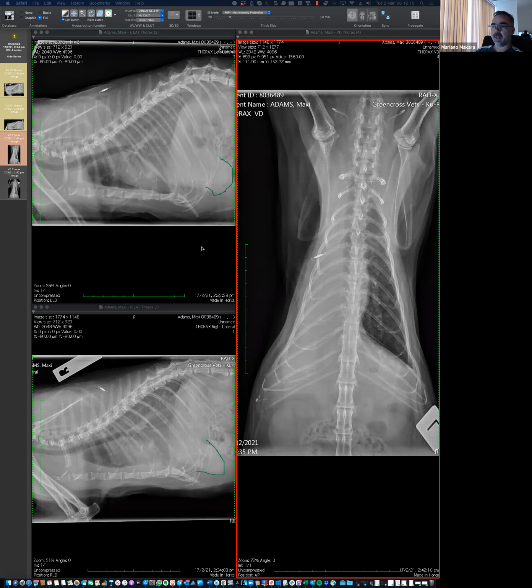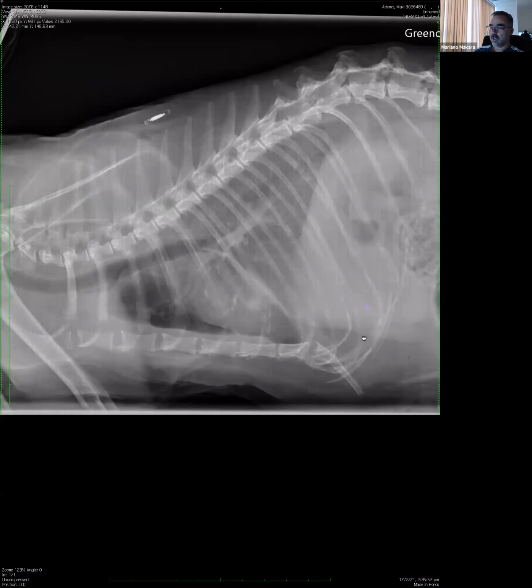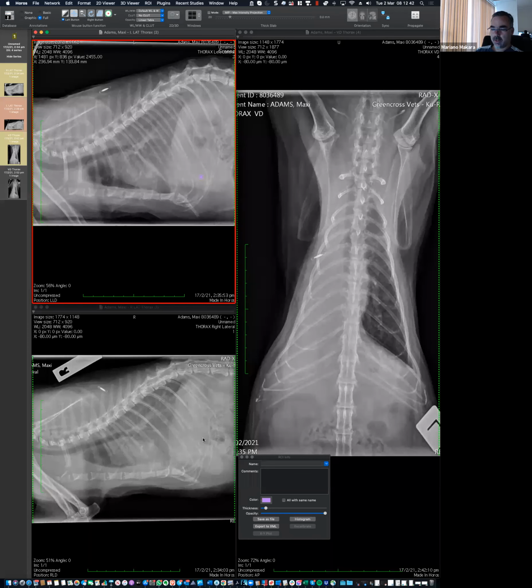There I would probably be a bit careful because I think here you are probably getting the stomach. I hope you can see my arrow. So let me double click. I'm pretty sure this is the pylorus and that's the colon. So I will not use this as the contour of the liver. This is the contour of the liver. So based on that, it's probably not that abnormal.